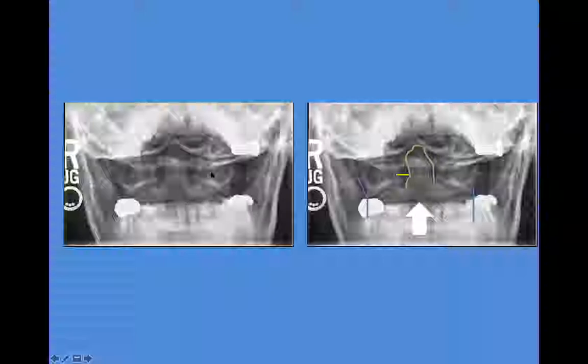When you go back to this radiograph on the left, you can see that that's symmetric on both sides. A little pitfall to be aware of is that sometimes when people are tilting their heads, that can cause asymmetry in this space. But when it's due to position, it's going to cause widening of one side and then narrowing of the other side. So that's how you'll know that it's positional, as opposed to if you have a fracture or disruption of your C1 ring, you should have widening of both of them.